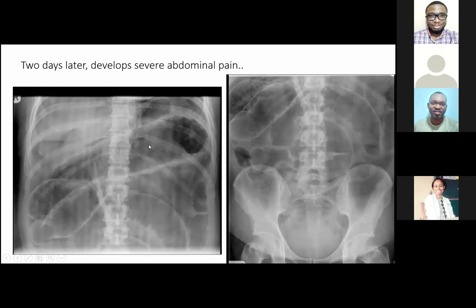And you can see on these two examinations here, on the left, he's got a distension of his transverse colon with thumbprinting. So during his admission, it certainly looked like he also developed toxic colon. Clinically, that fit as well because he was unwell, tender, with raised inflammatory markers. And also he's got distension of his small bowel. The other complication that you can detect on here is that he's got free gas in his peritoneal cavity.